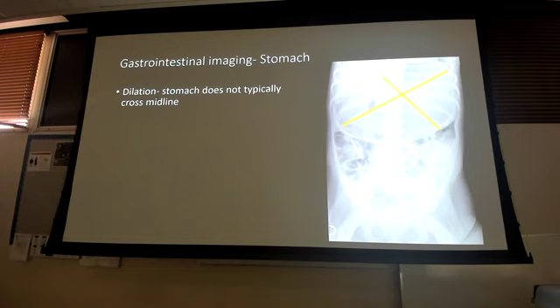The stomach is dilated, it's painful because they swallowed so much air while they're feeding due to a poor latch on either the bottle nipple or mom's, right? And so more common in peds, the stomach air, right? It's not the stomach, yeah, sure, it doesn't usually cross midline, but hey, in pediatrics, everything's kind of smushed together, right? So maybe it will, but what we've learned is the gastric bubble. We've learned about that, we've seen where that's at. That definitely does not usually cross midline. And this is just a bunch of air in the stomach, okay?